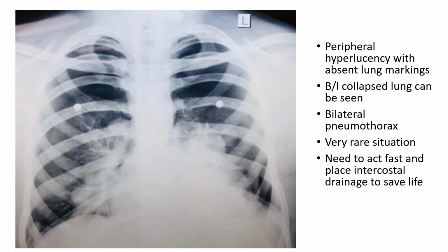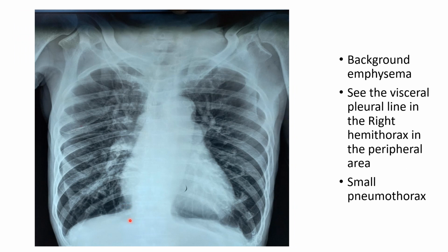Okay. So another X-ray. If you look superficially, it looks okay, but now if you see this periphery, this is a hyperlucent area here. It's a little bit avascular, and then you're seeing a margin here, right? So this indicates a mild pneumothorax.